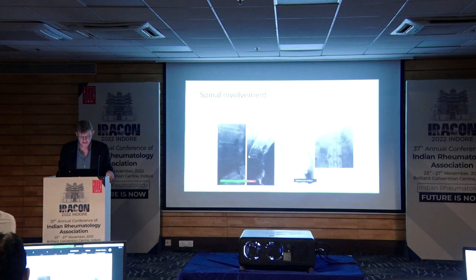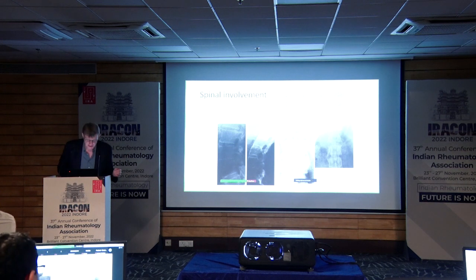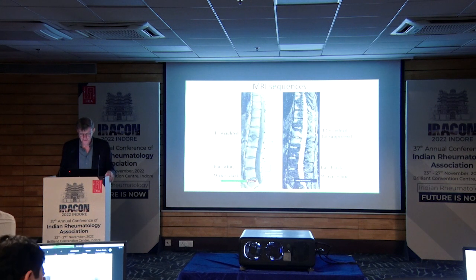It should also be mentioned that it's a very fragile structure. It's not strong as a bamboo stick. It's very fragile and can easily fracture because there's nothing, like the discs, to take the pushes they get. That's why we often see fractures. This you have already seen several times.